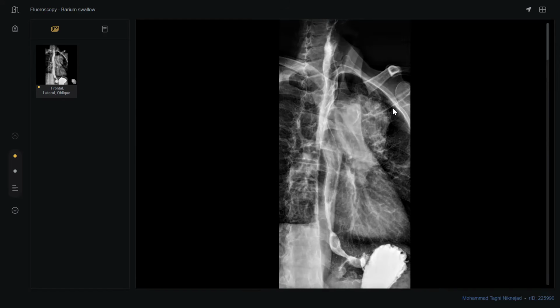Okay, so it may be calcification, which is present. So I need to have checked the control images. Okay, no control image. What do you want to do for this patient? It may be calcification. What else? What other differential?